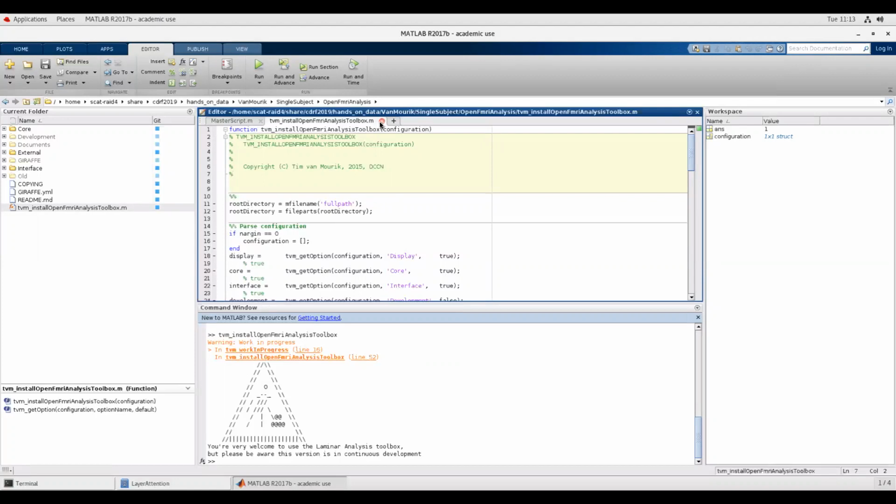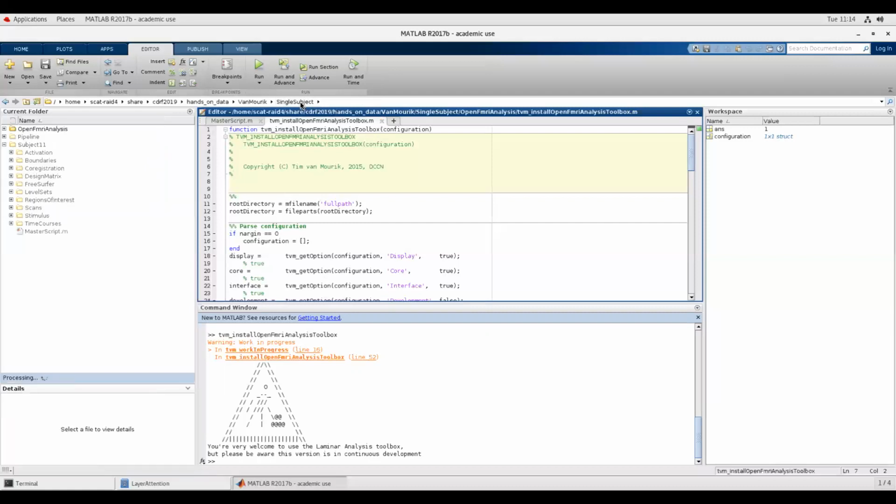Quick raise of hands. Who does this work for? Define work. If you can see this little warning sign, then it works. You can switch that off, by the way, but we're not going to do that now. Is everyone seeing that? This is ASCII art. So exactly, then you did it correctly. All right, so you need to pause here until I see ASCII art on the screens.